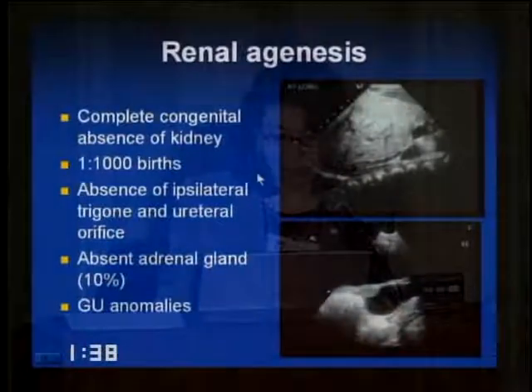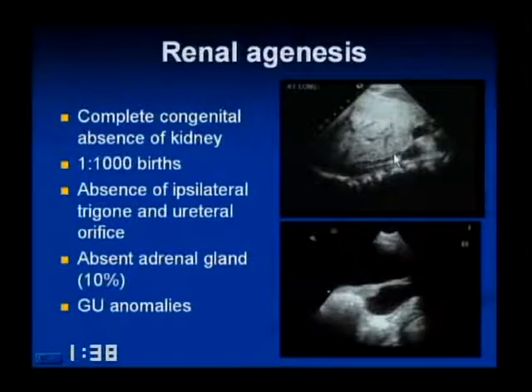The example on your right shows the lying down adrenal sign. You can see this beautifully elongated adrenal gland with the echogenic central portion and the hypoechoic area around it. I call that the Oreo cookie sign.